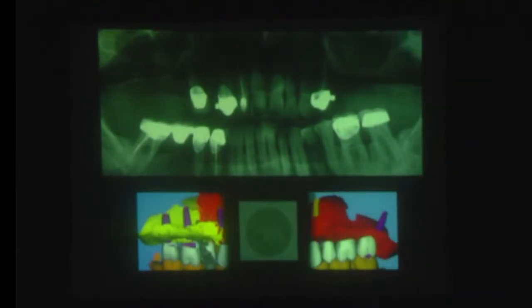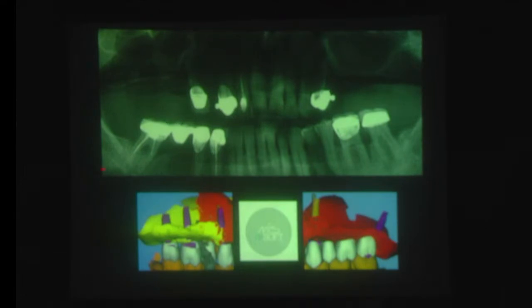So, once it is done, look, my friends, this was the plan, okay? This was the plan. There was a very big sinus here. Here you see the sinus. Here you cannot see the sinus, okay? I placed one implant here, one implant here. You see, this is the diagram on MSoft, thanks to MSoft. Look now, I placed the implants. Job done as planned by MSoft. You see, this part, this part, this part, this part.